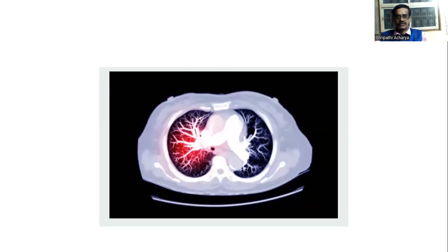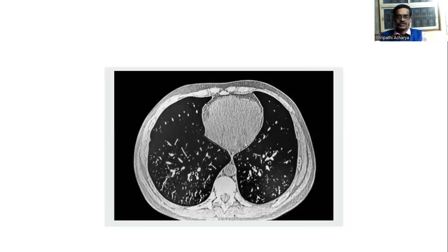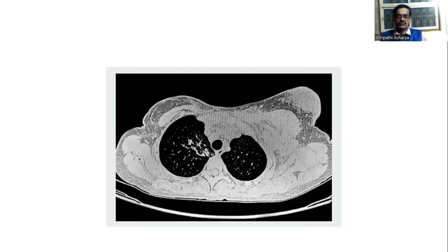Here you can see blood vessels and the tributaries. You can inject a radiopaque dye in the bloodstream, and you can visualize the pattern of the blood vessels. The film contains the tomographic picture of the chest. You can see heart, lungs, and thoracic wall. Another film which contains tomography of the chest.